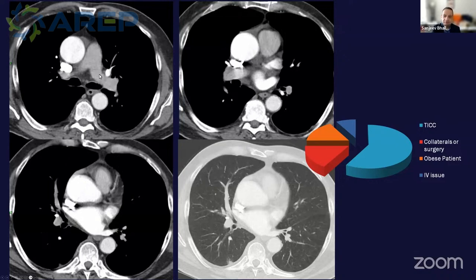What the deep breath will do is it will bring in blood from the IVC, and the IVC is unopacified, so it acts like a saline interrupter. The net effect is the superior vena cava will have blood that's interrupted with unopacified inferior vena cava blood. So now the pulmonary arteries are not opacified, and the aorta will have a little bit of contrast within it. When you see this, it is not indicative of a shunt, but of this transient interruption of the contrast column. So what can you do when you see this?